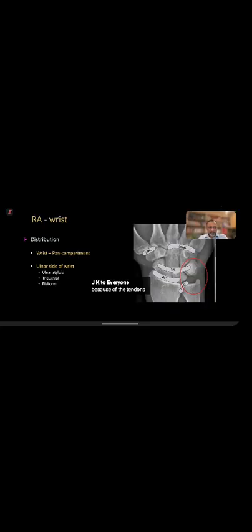Yeah, somebody, JK, said it's because of tendon. Which tendon is there? ECU, very good. What else? You think one tendon will do everything? You're right. But yeah, somebody said, Venkatesh said there is synovium in this region, and that is probably the right answer. Okay, let me just go back.